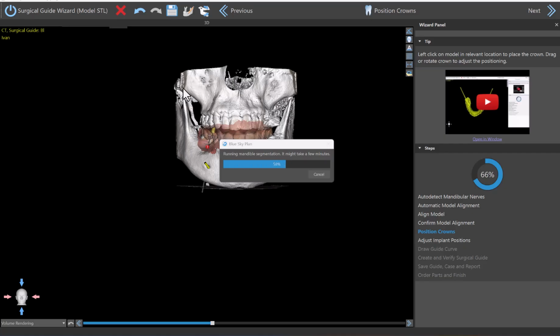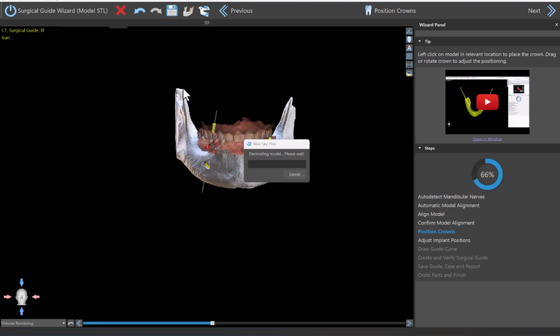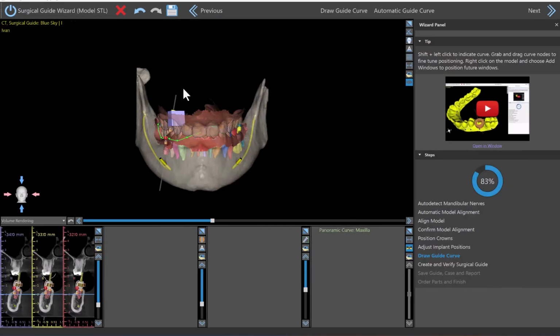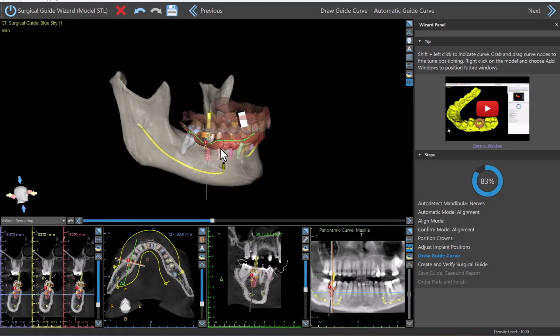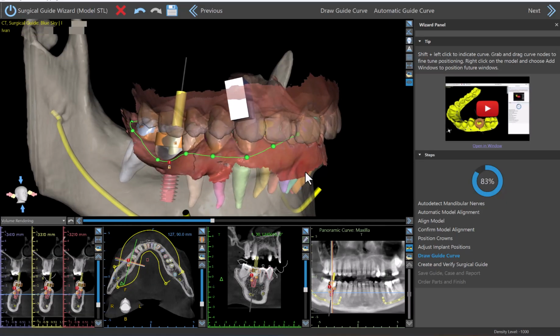But what it is doing also, it's identifying the available space to place an implant. It's identifying the relevant size implant to place, and it is placing the implant. We can see it's finished, in addition to placing and generating an AI tooth based on the patient's particular anatomy and adding everything to the scene.